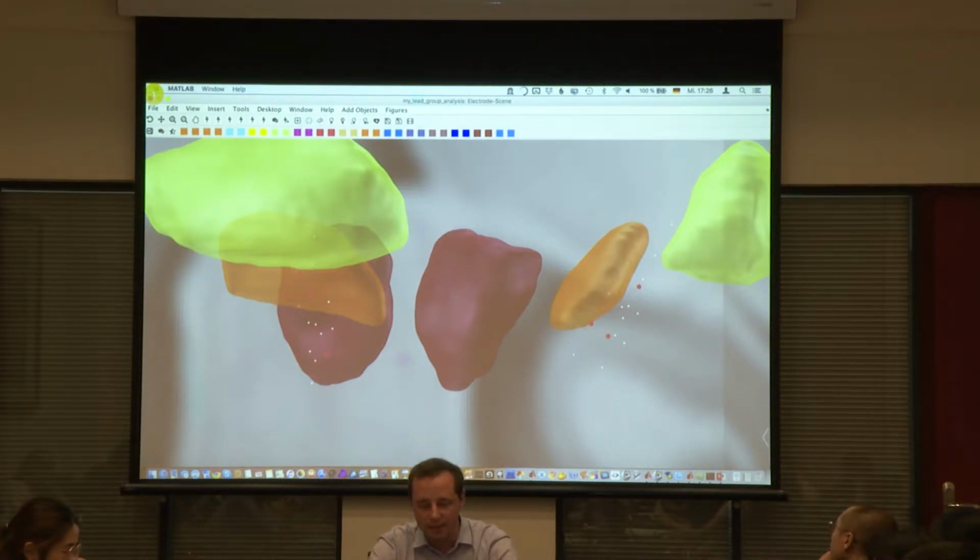Okay, and you can also see that the group colors also work in these point clouds. So we have different colors for these and these. If you imagine 50 patients of responders and 50 of non-responders, and you just plot it and you really get a good separation between the colors, this could already be really nice just to show.